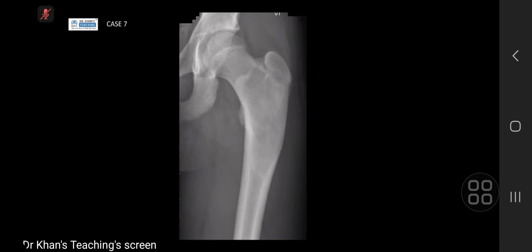Good. Okay, excellent. So yeah, this is a nice example of fibrous dysplasia. They can be mildly expansile, and you get that nice ground glass, smudged appearance internally, which is that fibrous matrix. It tends to be poorly organized, so you're seeing this kind of smudged appearance.